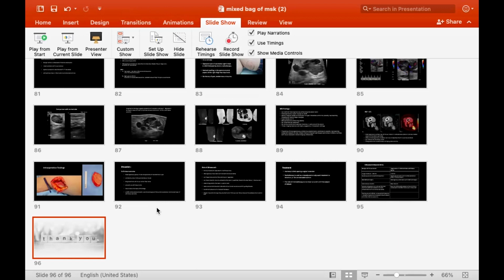Even with these large hamstring injuries, wherein you see the entire biceps, semitendinosus, semimembranosus is torn from the ischial tuberosity, if the patient is not an athlete, they will still manage the patient conservatively. They won't do anything.